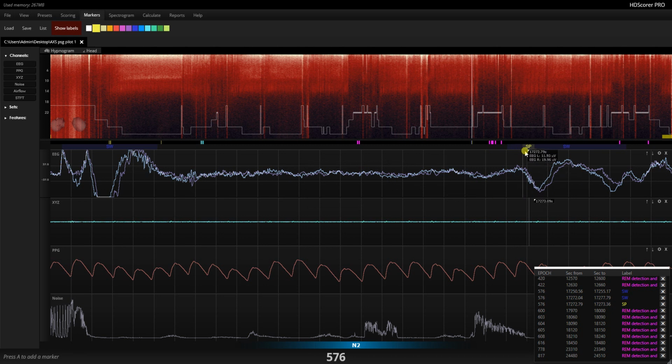And as you can see, they can overlap, and this is very important for cases in which you want to do some kind of automatic processing of the features, that you can have them overlapped. For example, in training some kind of dictionary or data set for doing later feature recognition, it's useful to have them superimposed.